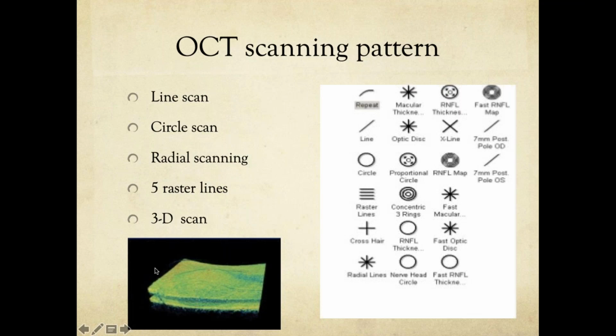But the other thing that you have to take in mind is the macular volume. While the central macular thickness is taken as just a single cross section and provides the highest resolution available around the foveal area, the volume is calculated by the same scans done multiple times over the area of the macula. Normally the volume of the macula is around 7.7 to 8 millimeter cubed.